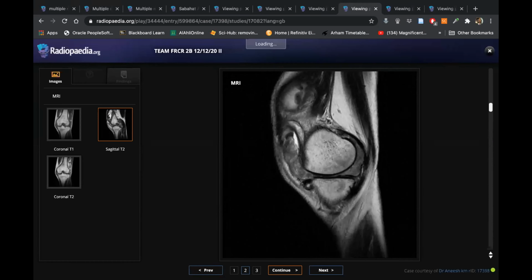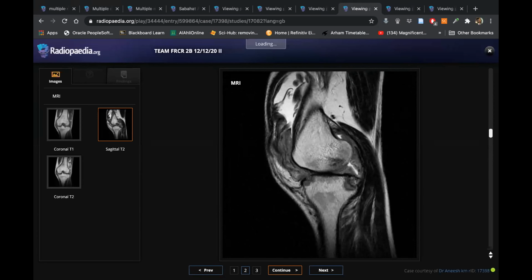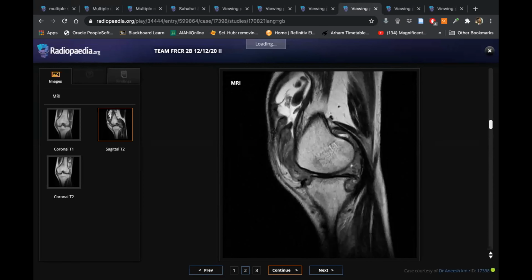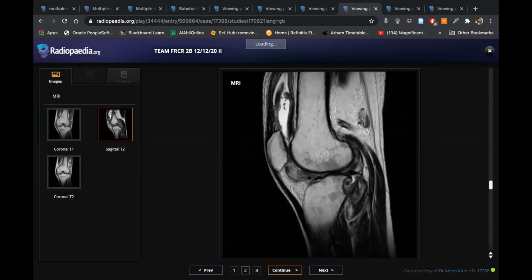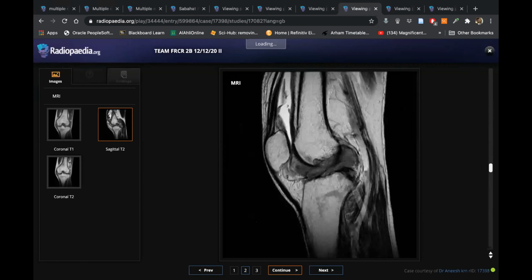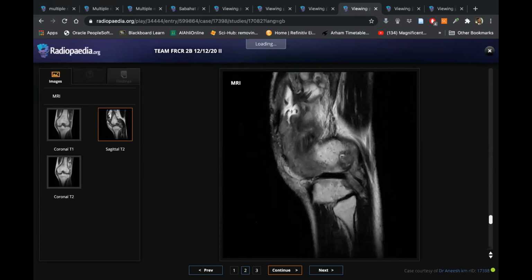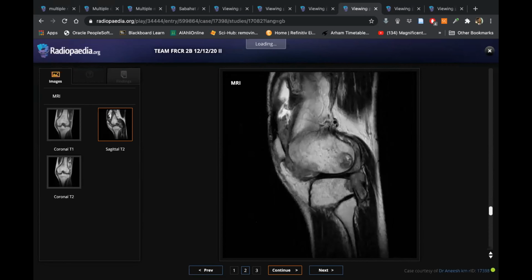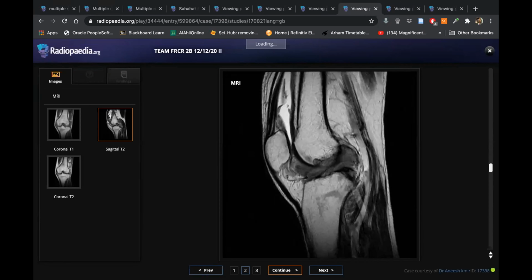You described it as large joint effusion. Yes, there are multiple nodules which are low on T2 and T1, right? There are defects in the lesions in the femur and tibia as well. This is due to erosions, due to pressure effect. So this is PVNS, but the fact that it was a 30-year-old male, I think hemophilic arthropathy is a very reasonable differential.